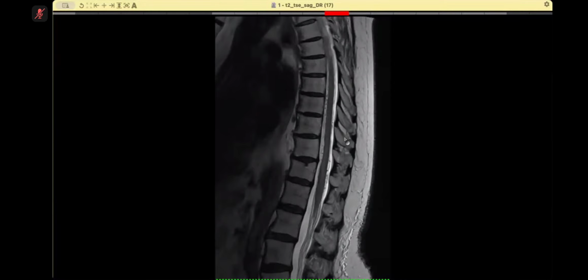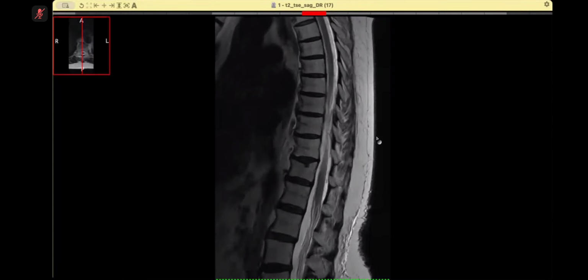And if you click down the drop-down list, then there'll be an option to say Request Remote Control. The view option is here, but ask for remote control is not here. Okay, let me then scroll for you. Now, I'm showing you a sagittal T2.